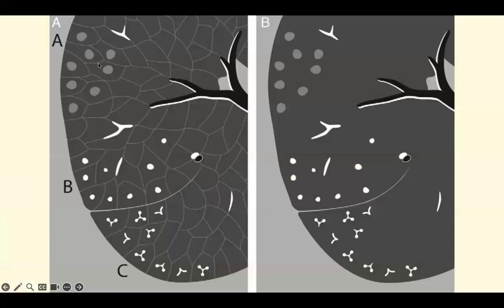They can branch into tree in bud appearance. So we have three groups. Each has different differential diagnosis. Here we have the ground glass nodules located at the center of the pulmonary lobule. If they are soft tissue density, they have different differential diagnosis. Here in the diagram showing the pulmonary lobules to show the location, according to this, they are almost evenly distant from each other.